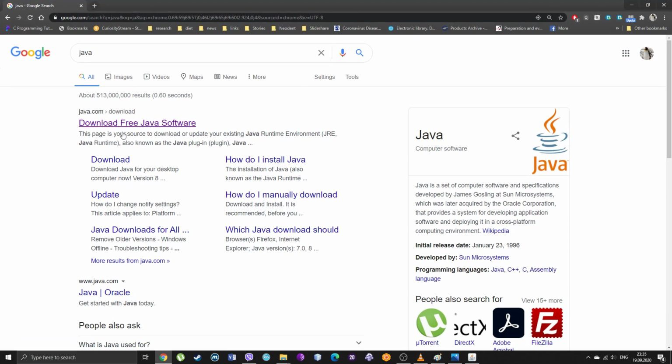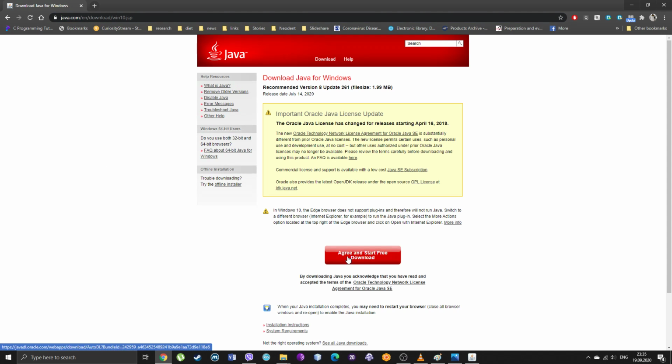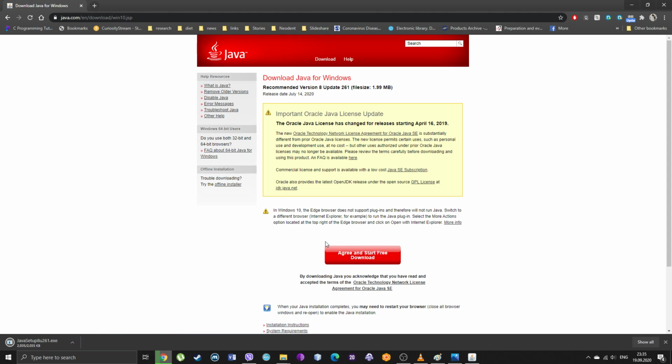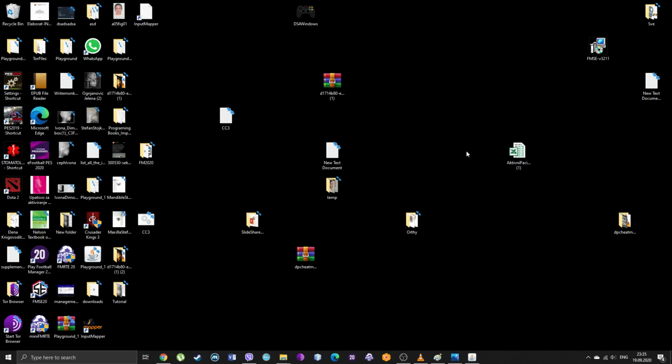This is the link, java.com, English, download. You just click this. You agree to everything. You can sell your soul here. Nobody cares. Nobody knows what we are agreeing to, but never mind. You click on the Java setup, and something will start installing. After finishing, I have it. I'm not gonna install it, but just install, next, and it's done. You have Java. After you install Java, you can run this program.